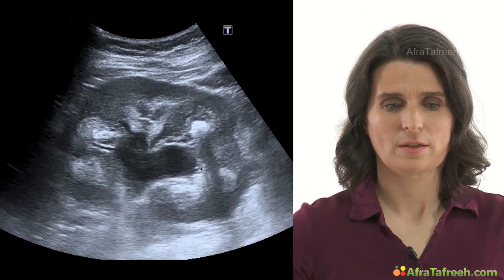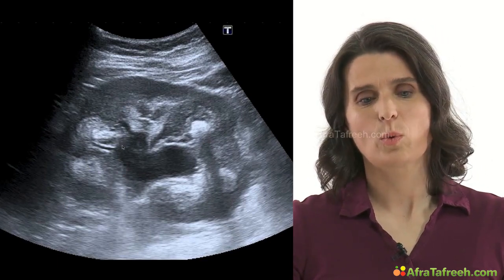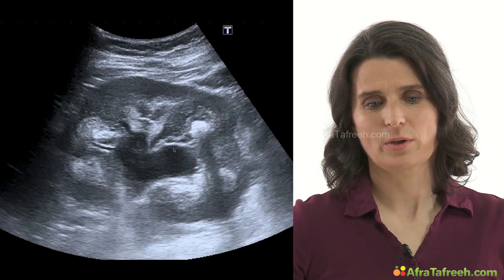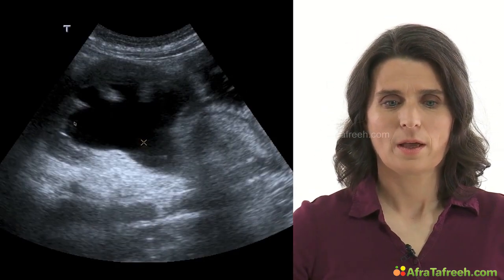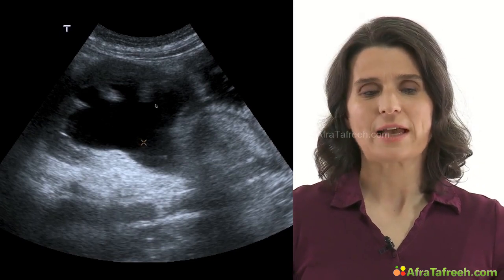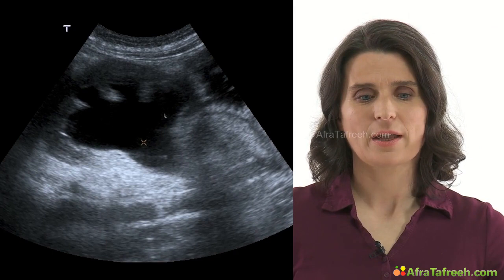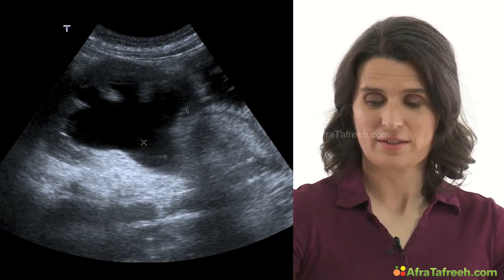This is again a picture. This is hydronephrosis grade 1 to 2. Again, anechoic in the center of the renal pelvis. And this is grade 3 to 4, a really dilated renal pelvis with a lot of fluid in it, anechoic, and the parenchyma over here already getting smaller.